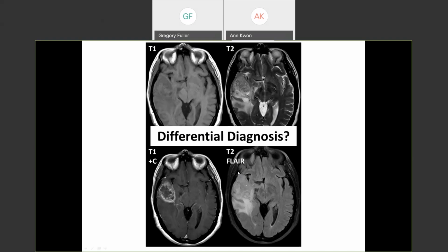Look what is happening here in the non-enhancing portion. Non-enhancing portion here and back here. Look at the blurring of the gray-white. Look here. Look at that gyrus. That's blurring of the gray-white. It corresponds to this area right here.